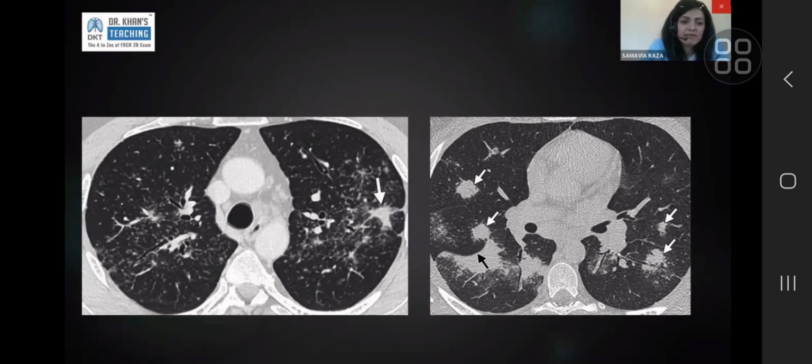It's the changes in the lung parenchyma that determine whether it is active disease or not. The abnormality you're looking for is nodularity: nodularity of the fissures, nodularity of the bronchovascular bundles. And when the nodularity is so advanced that there are a lot of small nodules sitting next to each other, they can also coalesce together, in what is traditionally called the galaxy sign. So it can look like a collection of nodules, and it can also look like one large nodule.